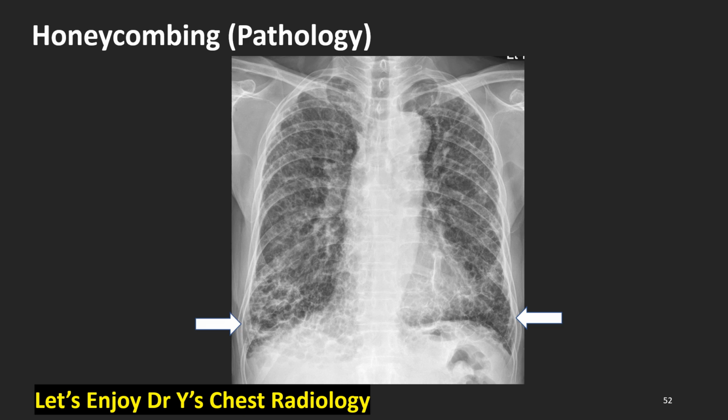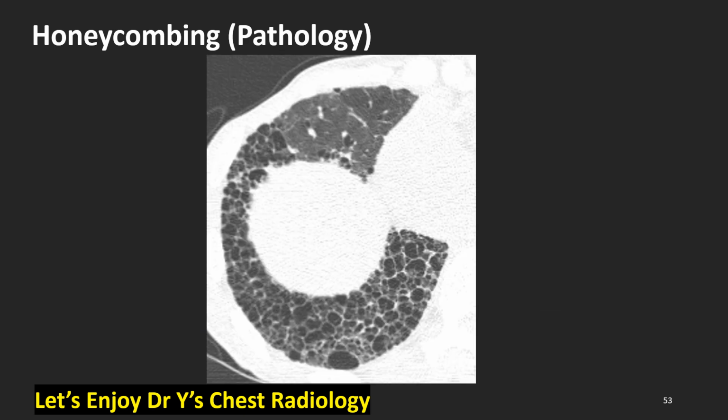Honeycombing, pathology. Arrows indicate the honeycombing. Honeycombing, pathology. We are watching the honeycombing in right lower lobe of IPF patients.